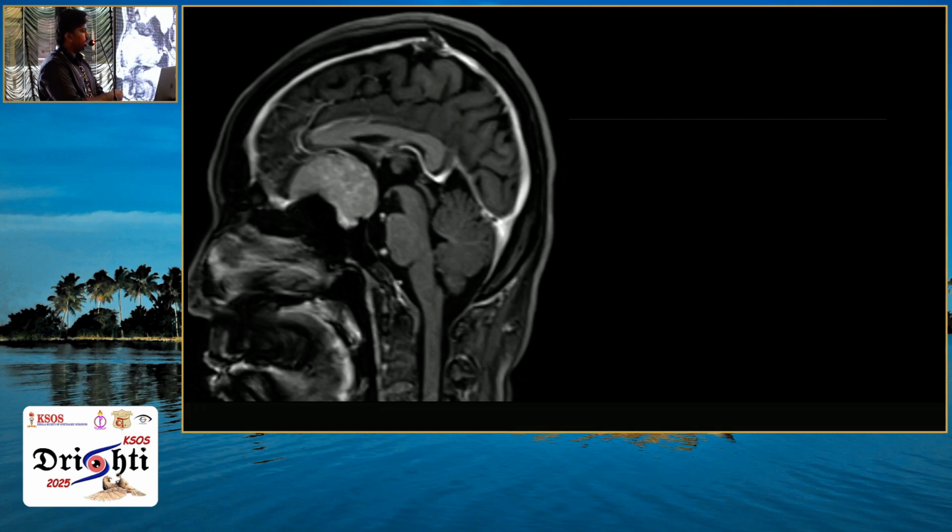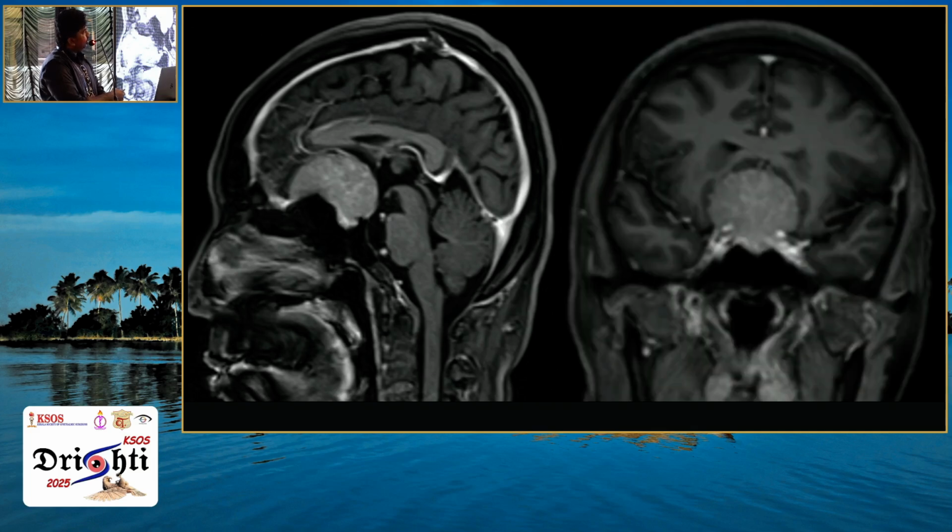Here, the pituitary gland is being compressed inferiorly, and because of the appearance and anatomy, because of the broad base, this is a sellar meningioma centered on the tuberculum sellae.